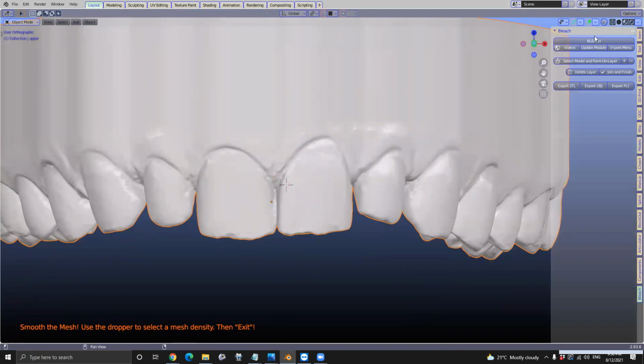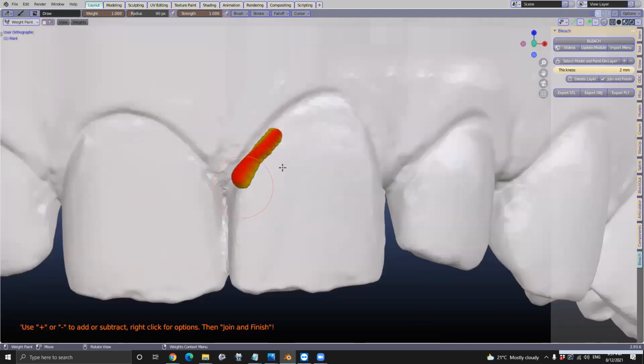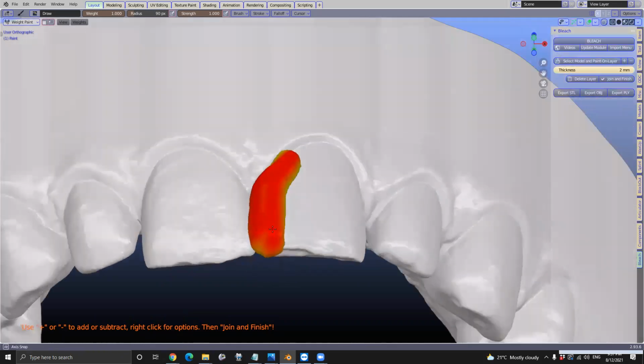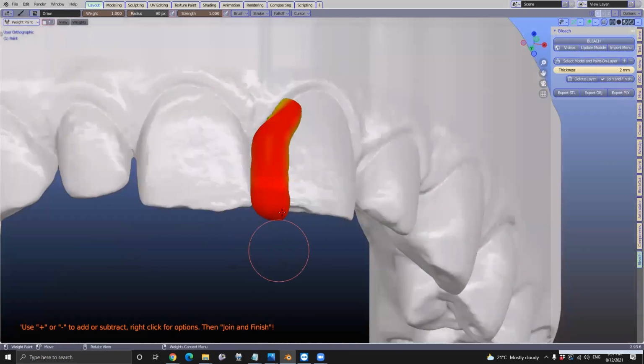You're still recording this, eh? Well, yes, I am. So we're going to select that and paint on a layer, and you can pre-make tooth preparations like that as well, I suppose. So we're painting on a layer like that. And then we want to use that as a cutting tool.